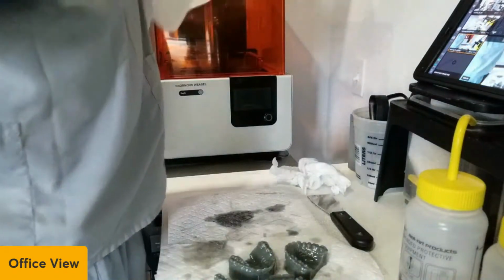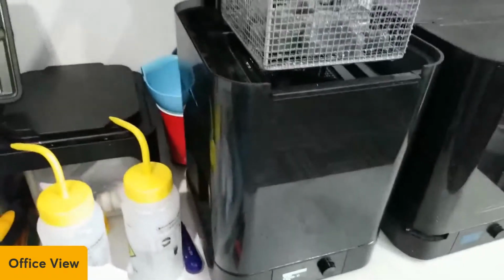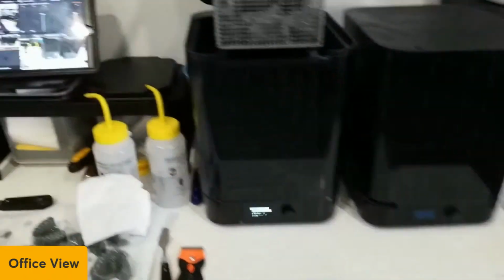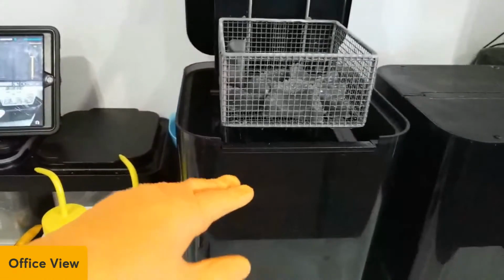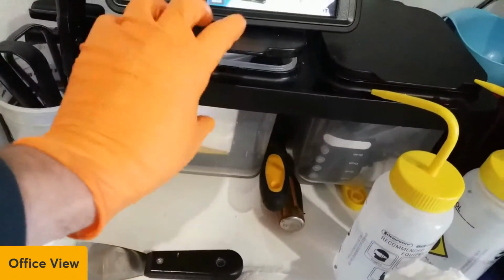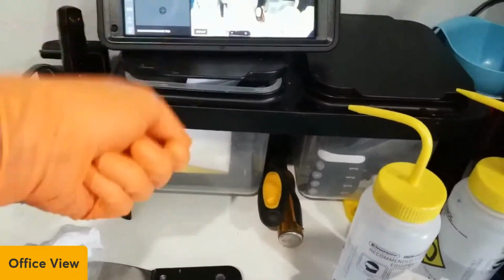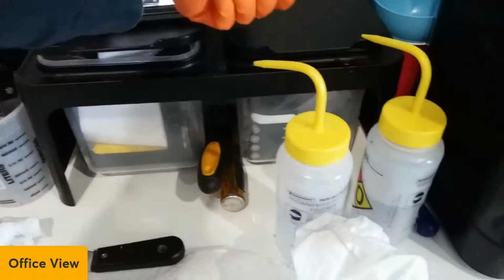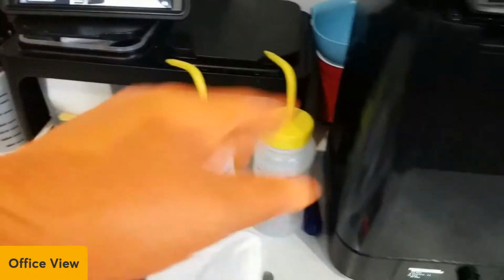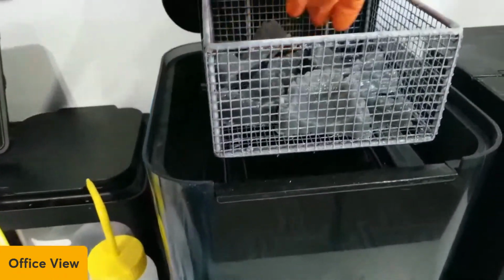So this has now, so notice it now says 11 washes. All right. So, and it's raised up out of the alcohol. Now that's the key feature I wanted. I wanted to set it and forget it. I didn't want to have to come back. Now this right here is the wash that comes with the printer by default, and you got clean, you got dirty alcohol, and you got to put them in here and soak them for 30 seconds, and then you got to hand agitate it for 30 seconds, and then you got to put it in the clean. You got to do the same thing, and then you dry them. This one does it all, and it ejects it out of the alcohol, and it starts drying right here.